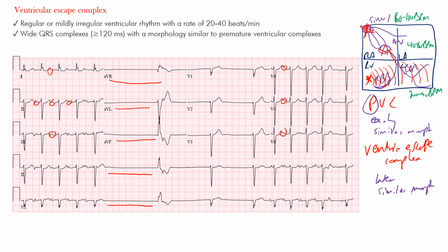But there's no beat, okay? You can still see there's no beat here. And so then the AV node tries to go around that rate between 40 and 60, and nothing then kicks in. And then finally somewhere in the ventricles takes over pacemaking function. And how do we determine that that's the amount of time between 20 and 40? Well, you can kind of estimate.